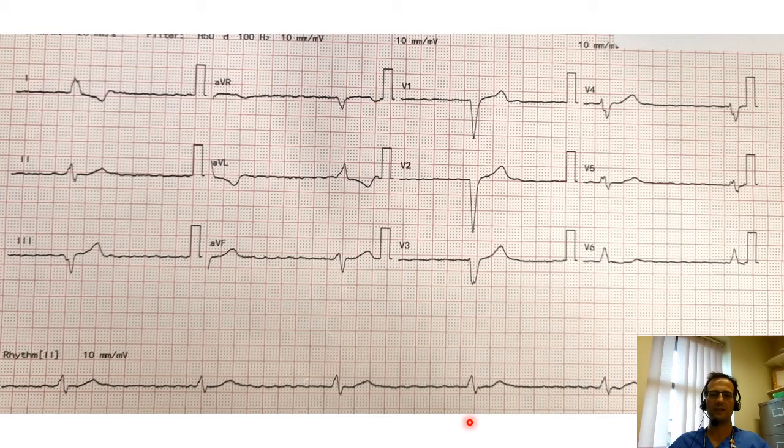What about this ECG? So QRS duration is more than 120 milliseconds. Can you see in V3 we're getting a little bit of fractionation of it, which is our W that we talk about with our left bundle branch block. We've even got almost an M in V5. So this is left bundle branch block.